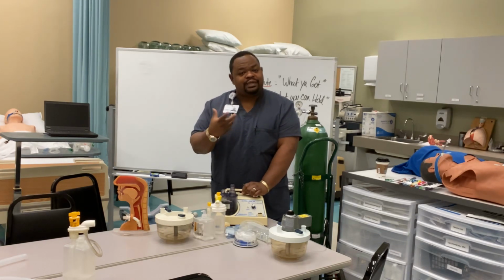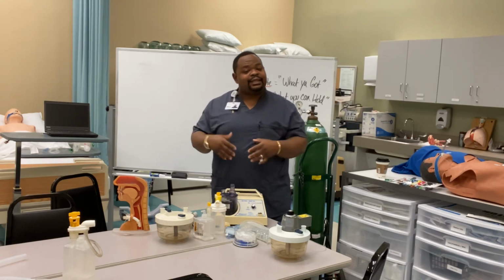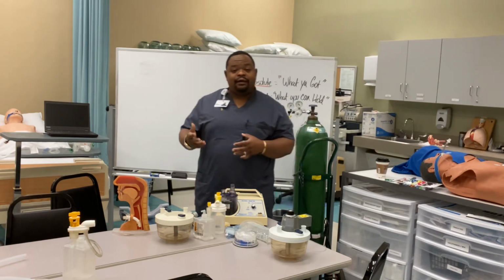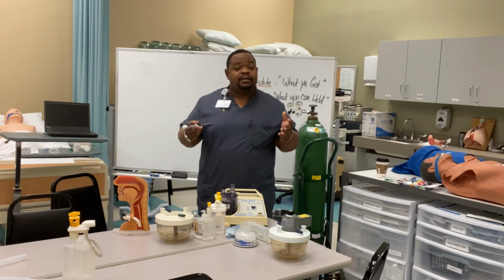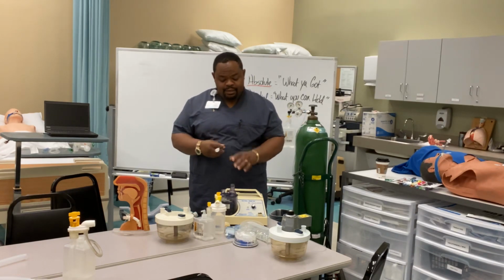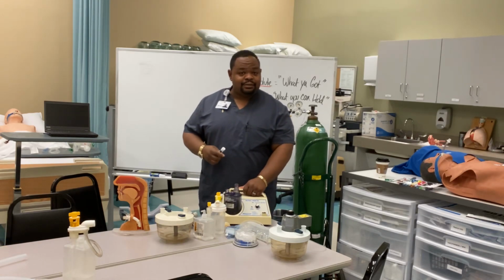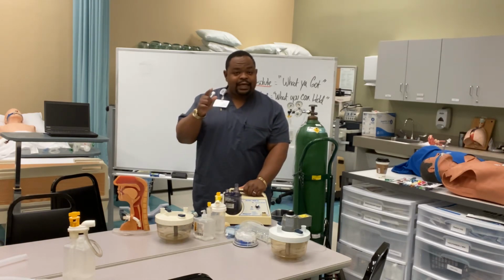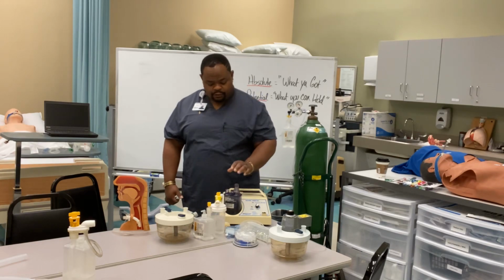And that's when I use that to get a sample from you, and then take it to get it gram stained, right? See if you have Pseudomonas, tuberculosis, whatever the case may be, or the suspicion may be, okay? But that's the ultrasonic nebulizer. You see, I talked about it a lot. It will be on the test, right? 90% of its particles are 0.5 to 3 microns, and it can produce up to 6 cc's per minute of that mist, right? All right, that's the ultrasonic.